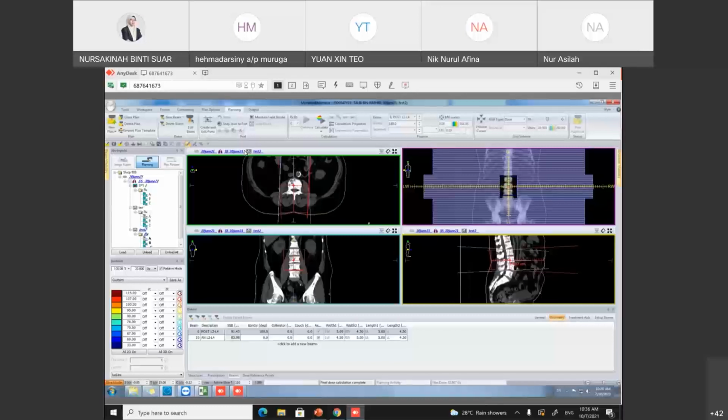Means if the patient body separation is 20 cm, you will put your ISO center at 10 cm depth, and if laterally 30 cm, you will put your ISO center at 15 cm, like that. So you will see exactly the red color ISO center is at your center. Like for example, this patient I shift to mid-plan for you. Just now is 24 cm.